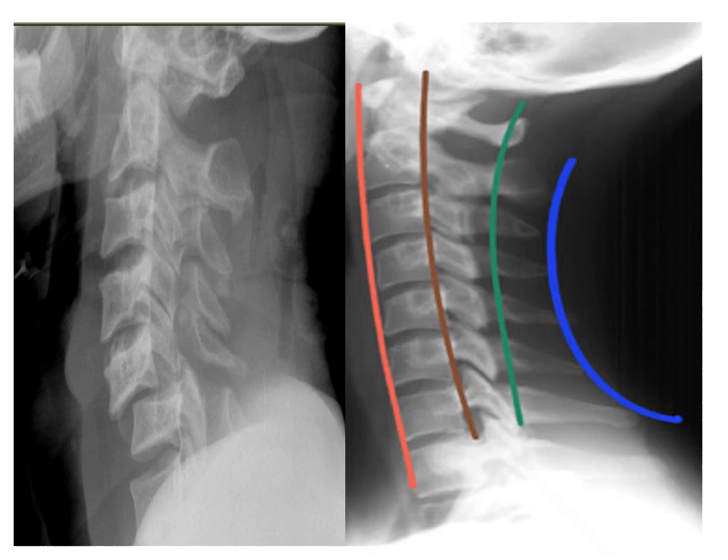Now in this image there is a disruption in the anterior line. Here there is disruption in the anterior as well as the posterior line, where we can see the vertebra C2, C3, 4, 5, C6 is retropulsed or displaced posteriorly, and there is also disruption of the green line, the spinolaminar line. We can see this clearly in this X-ray image, and there is also loss of the cervical lordosis. This way we can compare and assess the alignment of the spine.